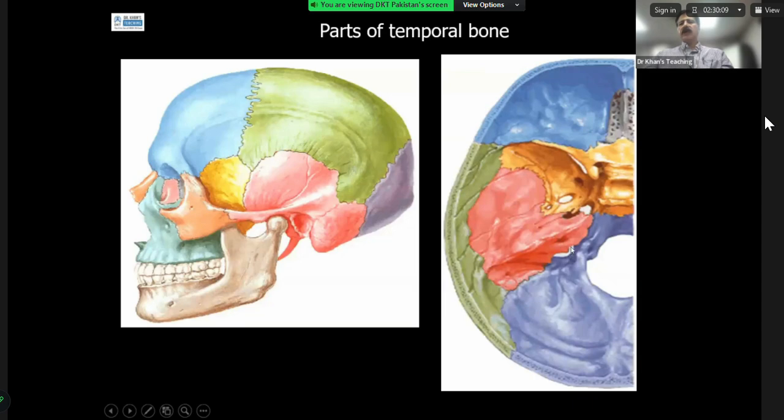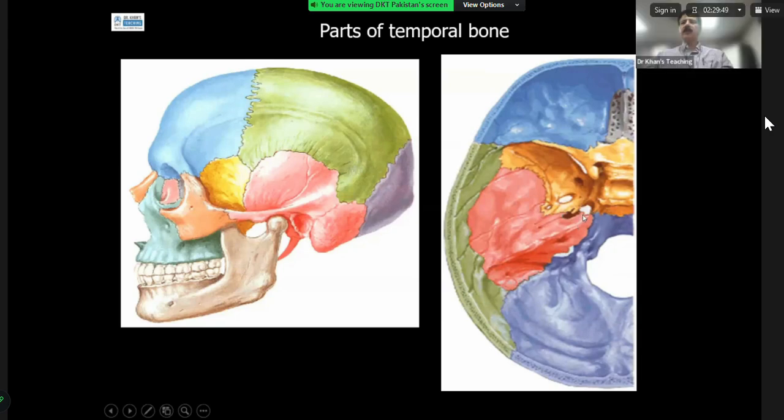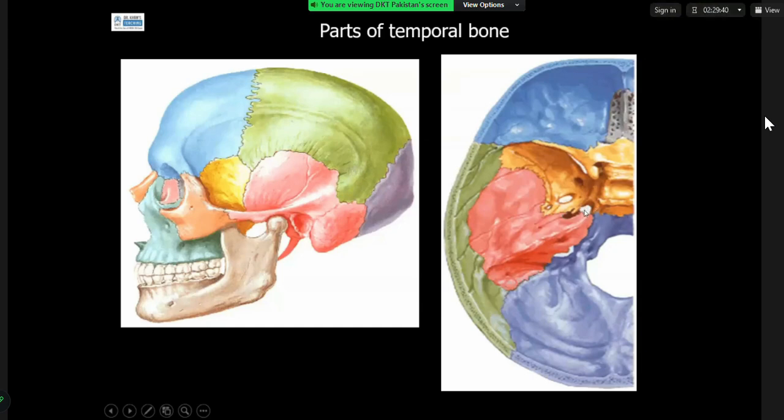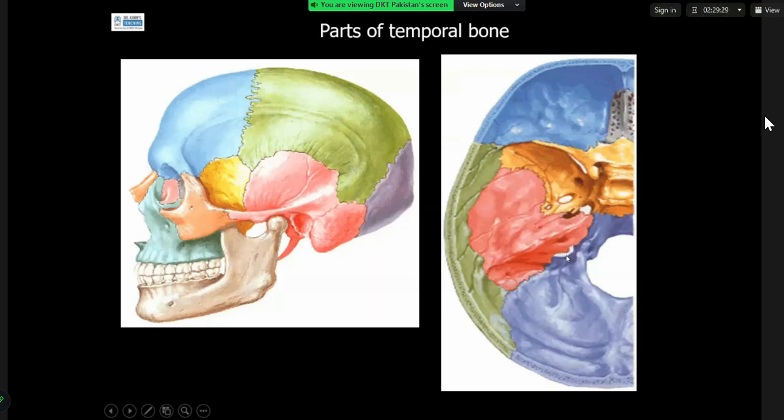Now, candidate 1, what is this foramen? That one below the lacerum. So lacerum was here. Yes, lacerum. And nothing of interest passes through, as I was telling you. In a cadaver, it looks like this. Otherwise, for us, nothing important passes through it. What is this? This is very, very important. Hint: this is the jugular foramen.